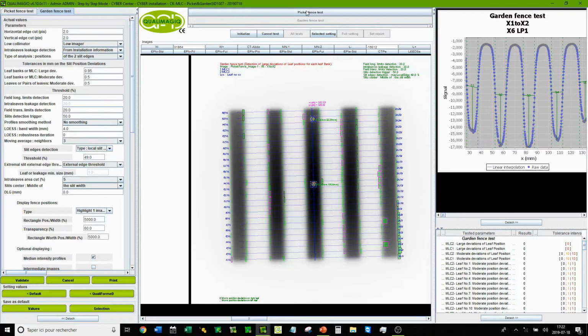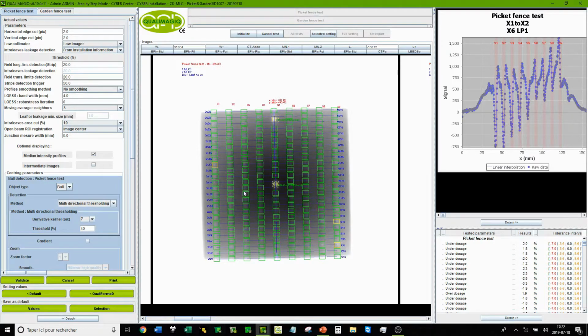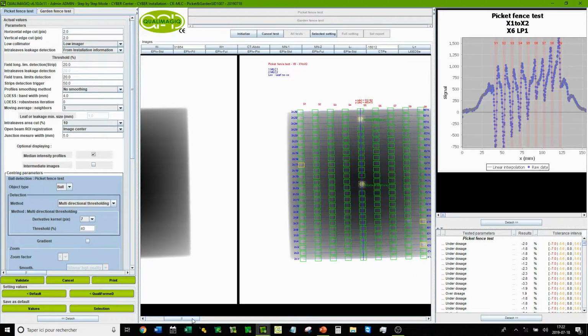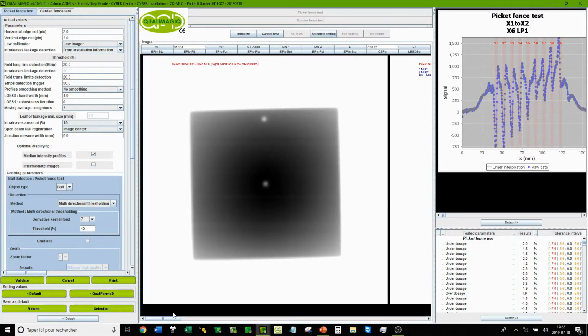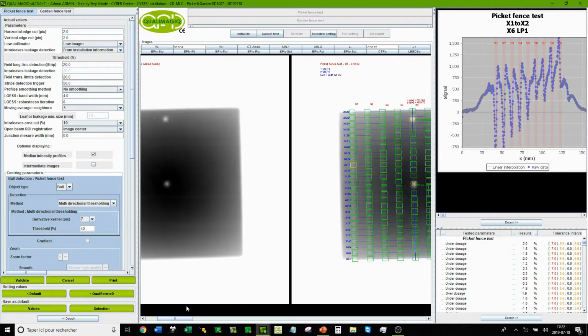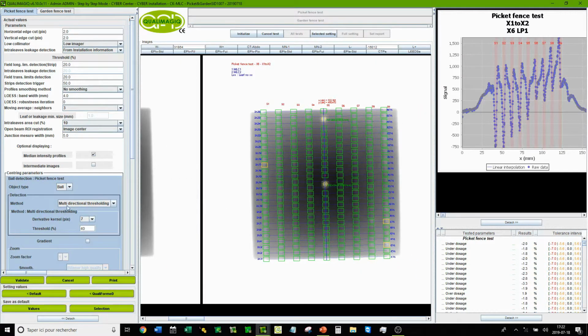Next is the picket fence test. Here we test what is occurring at the junction of contiguous radiation bands to test the over and under doses. As we are dealing with those measurements, we subtract from the images an open field to remove all that is due to imager response and to beam non-homogeneity. Once we have subtracted the open field image from the tested image, we take measurements of over and under doses.